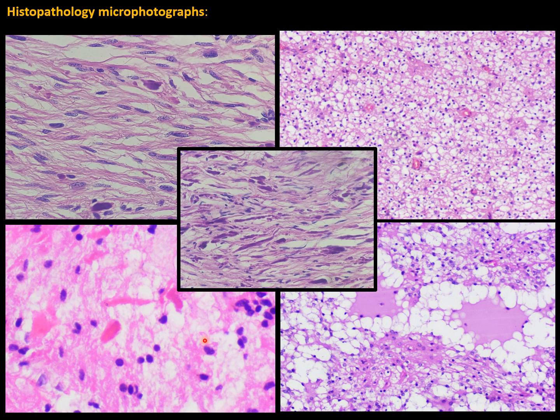Rosenthal fibers may also be found in non-neoplastic tissues, that is, in tumors which are slow growing, and the peripheral part of the tumor may show presence of these pilooid structures. So, for example, a suprasellar craniopharyngioma or a hemangioblastoma, in the peripheral portion of these tumors these pilooid structures may be present. So one should not mistake these for pilocytic astrocytoma. You should look for the components of craniopharyngioma and the hemangioblastomas.